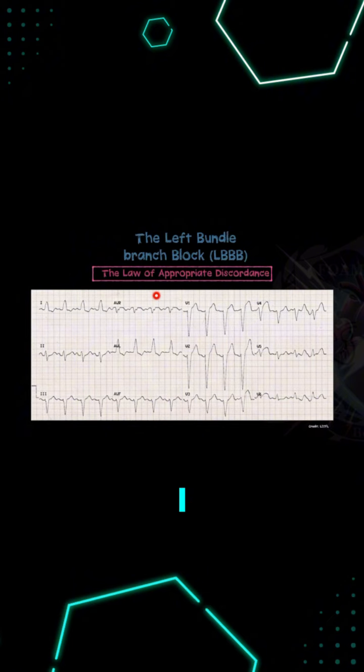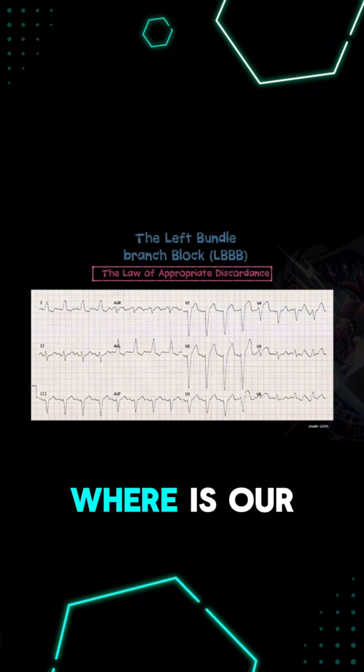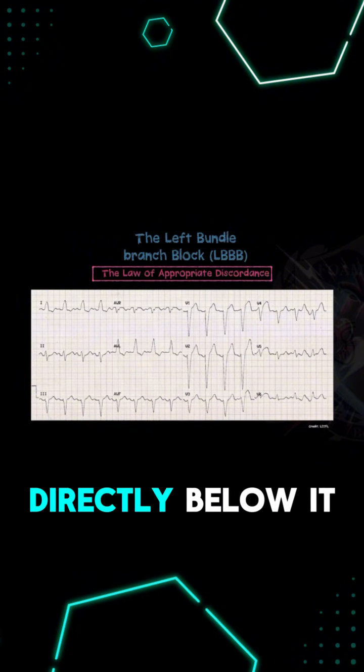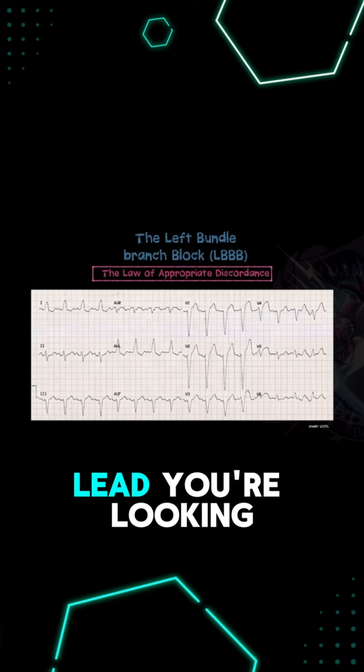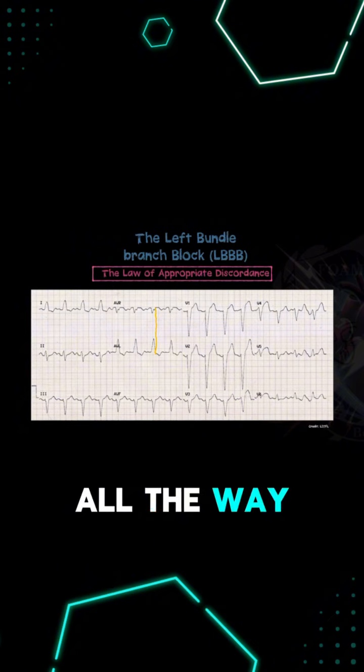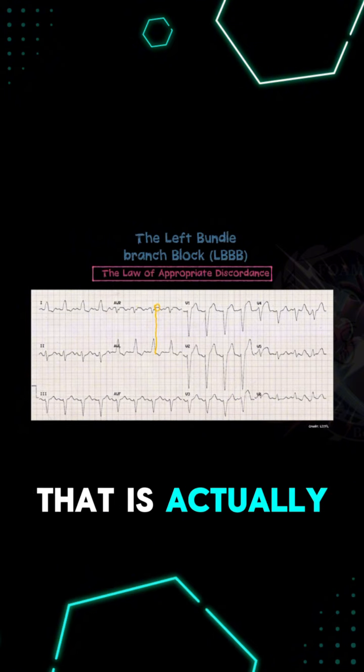Now one thing, and the reason I liked this 12 lead is I wanted to point out in aVR, where is our J point? And if at any time you're asking yourself this question, is that notching on the QRS complex, where is the actual J point? One thing that I like to do is in this case, in aVR, you can look at the lead directly below it or above it, depending on whatever lead you're looking at. So let's look at aVL. We can clearly see that the J point is here. So if we take a line all the way up, that is actually your J point.